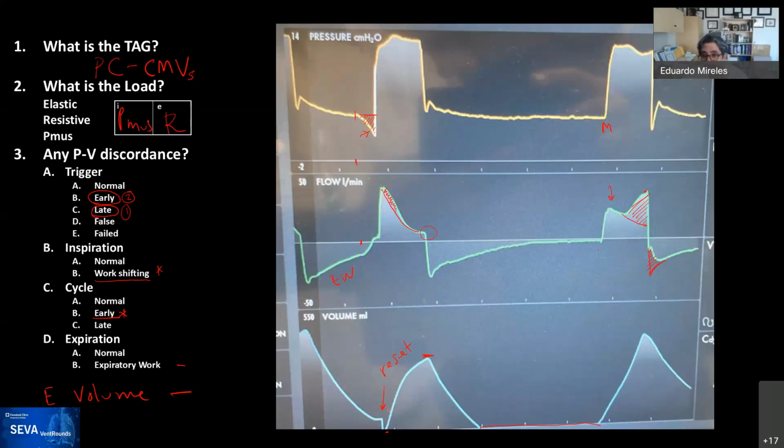Yeah, actually, this is a good example of potentially air trapping. This breath that happened right here, where I put reset, is where the patient took a breath, it's exhaling, and you get this square root sign, but that doesn't necessarily mean that there's a leak. It may be that the patient took a breath right on top of the other one, and then exhaled the extra air that was inside, so you couldn't see it. Excellent point, Rob. Thank you.